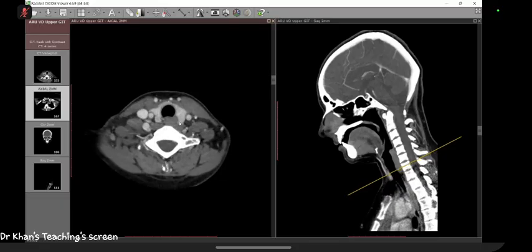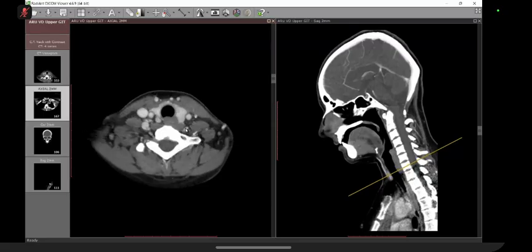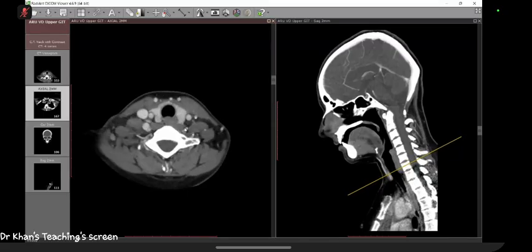So if you see, develop your eyes on this finding because it's a tricky one. If you go back to the anatomy of the trachea, the posterior wall is sort of a straight line and it is not hard. So the esophagus can sort of project into it. And that is why it becomes very difficult to call it a T4.